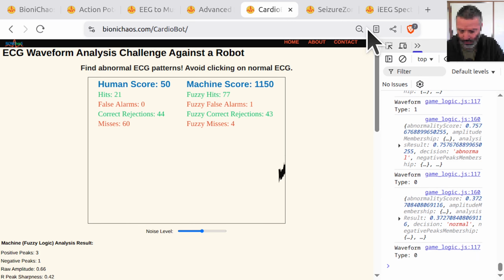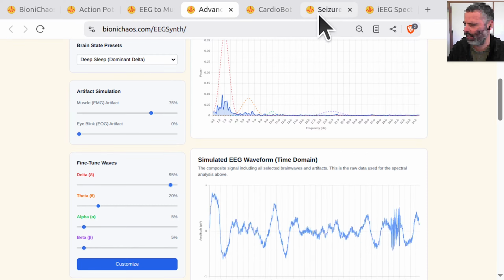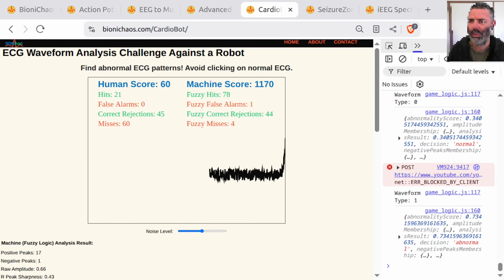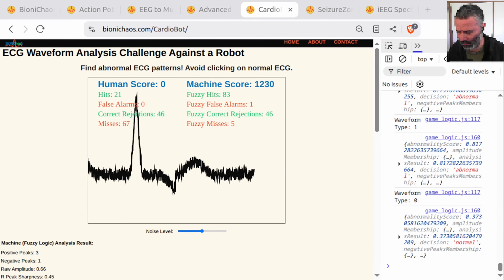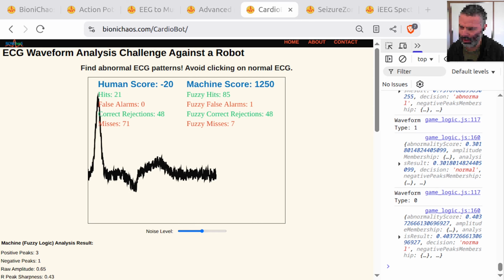A description of the CardioBot. It's the one we just listened to, didn't we? But it wasn't very comprehensive. Yeah, we'll do another one just about this tool. This is for the purpose eventually of redoing the whole lot.